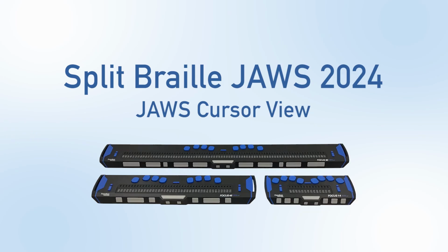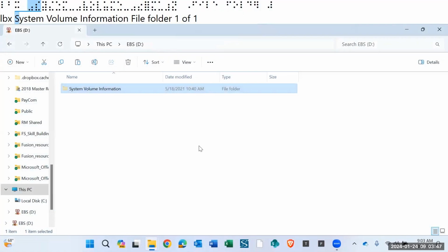The new Split Braille feature in JAWS 2024, JAWS Cursor View. This view is helpful in situations where you may want to monitor a progress bar or application taskbar while working on a document, or in other situations where you may be monitoring a taskbar or some other item with the PC cursor and need to watch another location of the screen using the JAWS cursor. I'm going to demonstrate this for you now.